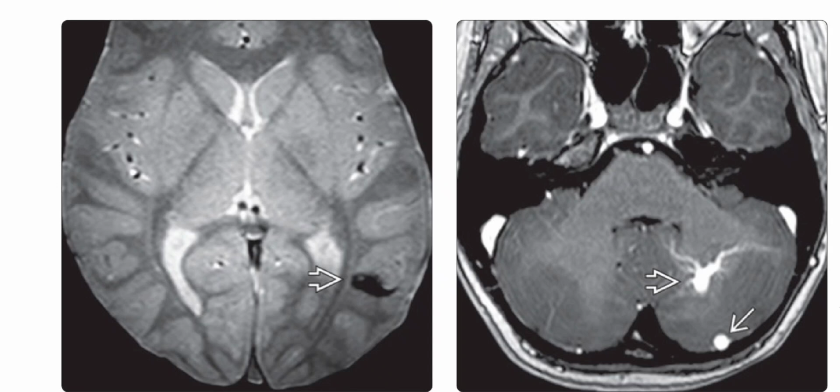Right is the axial T1 contrast-enhanced SPGR MRI in a child with diagnosed case of hereditary hemorrhagic telangiectasia, and it shows a left cerebellar DVA, which is draining into a posterior pial vein. DVA, that is developmental venous anomalies, although not specific, are more common in hereditary hemorrhagic telangiectasia than in the general population.